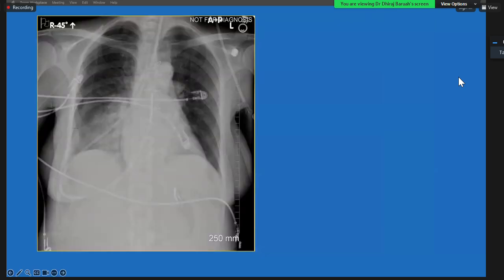Then talking about abnormalities, when you know the anatomy here, this is a patient with gastric tube evaluation, so you know what the course of the bronchi should be. This goes through the trachea, the right main bronchus, and goes quite to the midline.